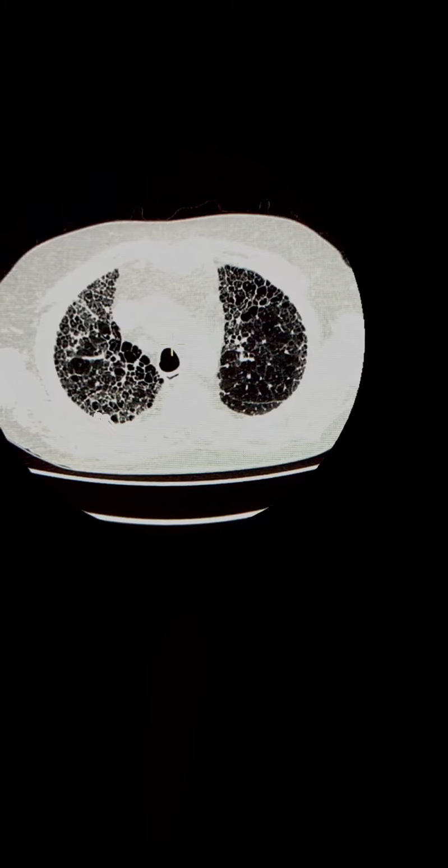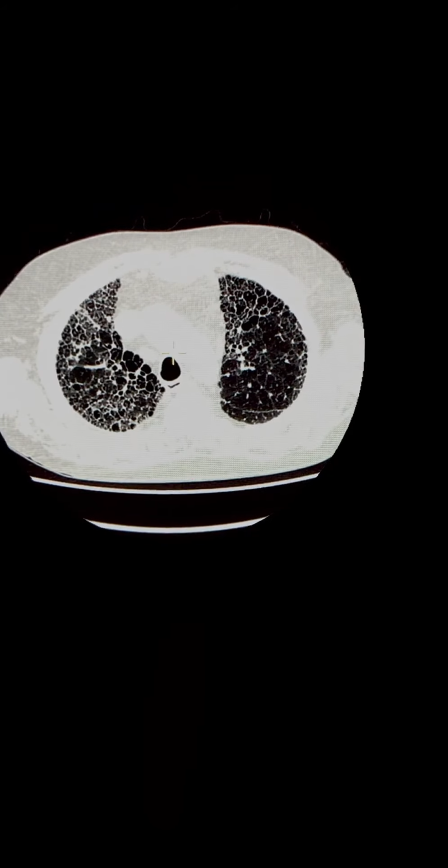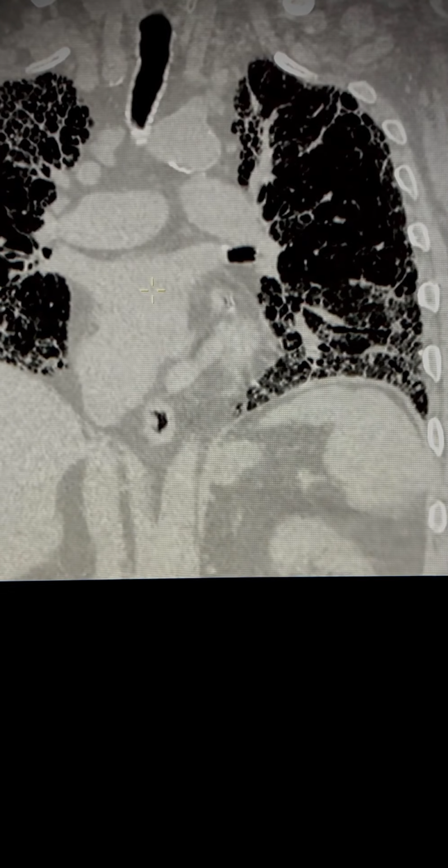To sort out whether the observed cystic pattern is due to emphysema or purely due to interstitial lung disease process, the best method is to assess the airways and their orientation. You're better off doing this on a sagittal or coronal image. So we're going to get a relevant coronal image and get it into an appropriate zoom setting and centerline it so it becomes quite clear.